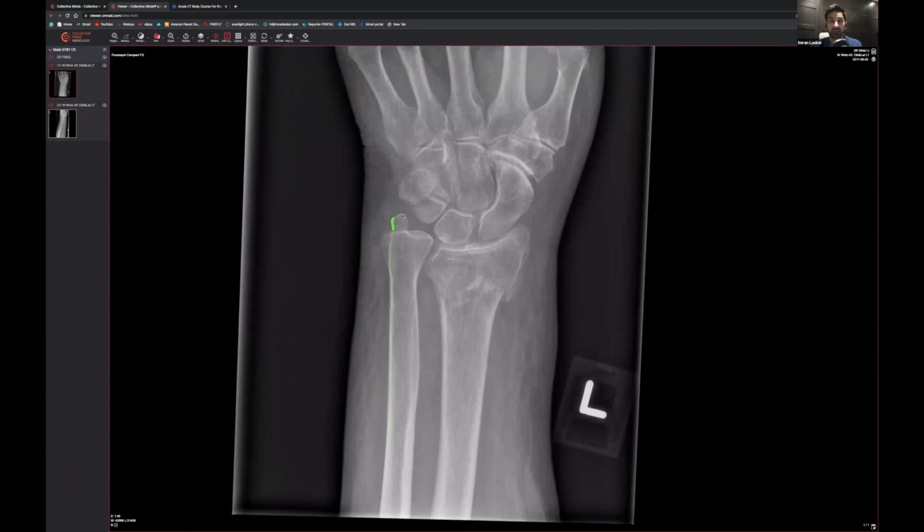One of the things to look for is the ulnar styloid. Often with any sort of radial impaction fracture, you can get an ulnar styloid fracture, but that actually looks okay. And you can see that this is kind of a bit longer. This is longer than this, and usually they should really kind of meet with one another. So clearly there's been a bit of loss of bone in this area, and therefore that would be what was called a positive ulnar variance.